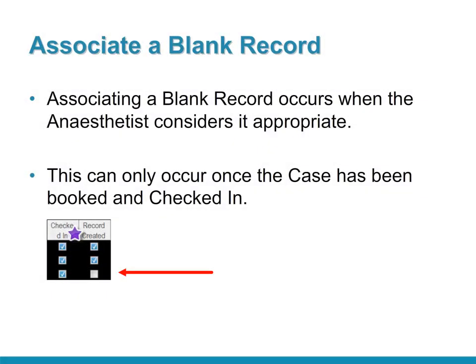The blank record is associated to the case at an appropriate point in time. If the patient needs to be transferred out of theatre before the association can occur, anaesthetists may suspend the case and associate later. Please note that a blank record may be suspended but cannot be finalised. All SAA anesthesia records must be finalised.